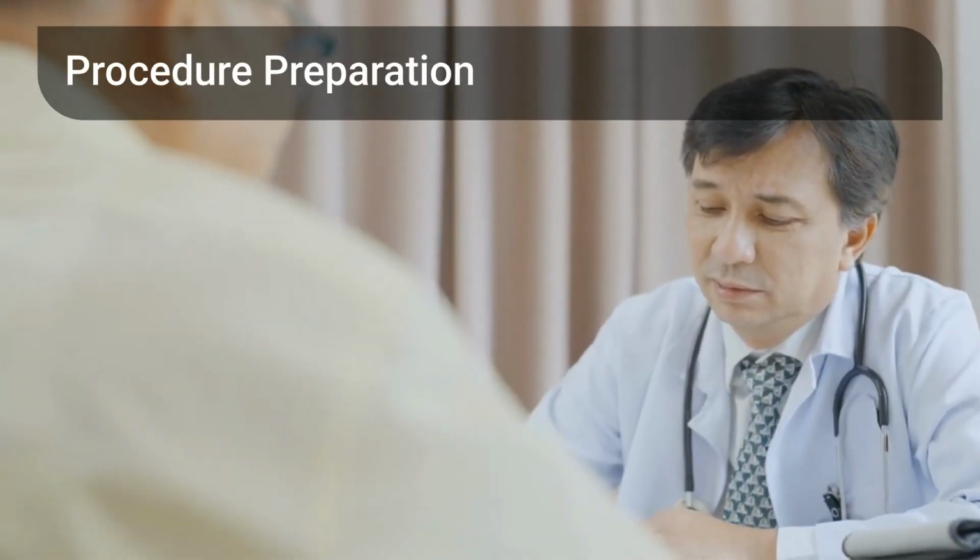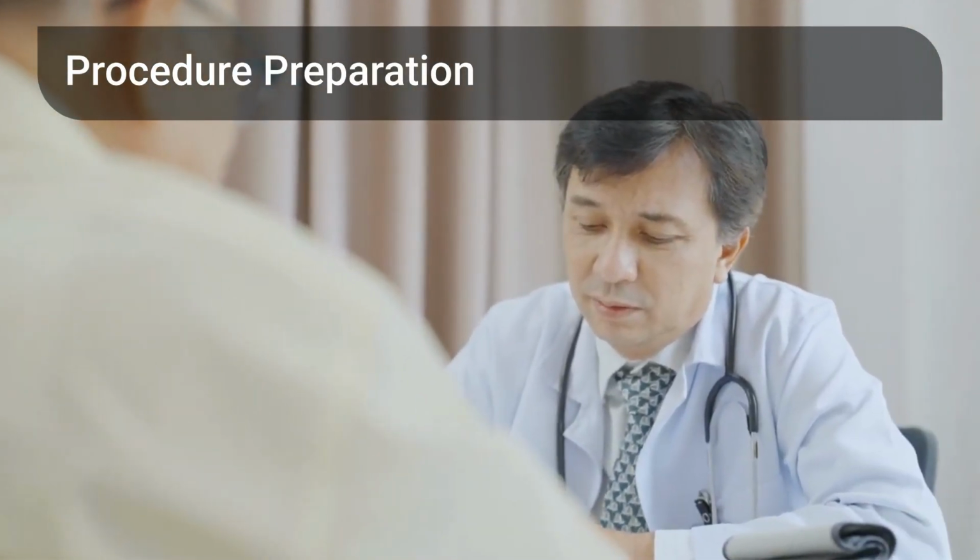Proper preparation is key to a successful stent placement. Let's look at what that entails. First, the medical team conducts a thorough assessment, including reviewing medical history, performing physical exams, and running necessary tests to ensure the patient is ready.